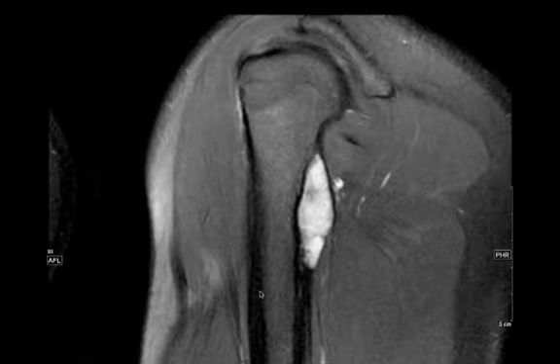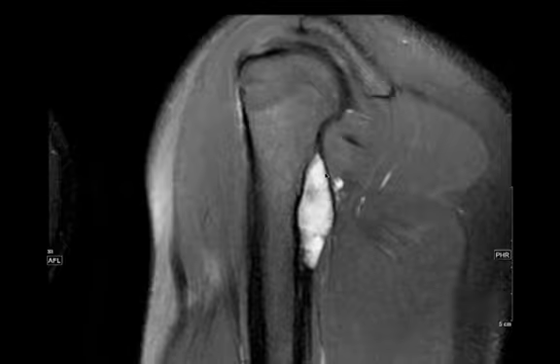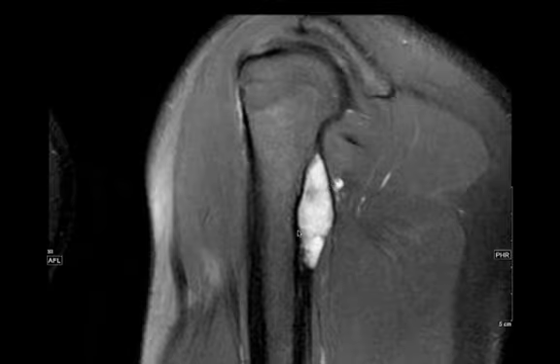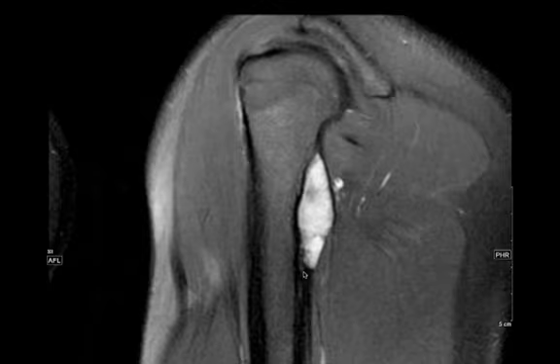This was a coronal MR just to show you a nice example of a juxtacortical lesion, very bright on the T2 weighted sequences. This one turned out to be a juxtacortical chondroma, just to show you what one looked like. Really nice example of how it's arising right next to the cortex of the bone, kind of in the periosteum, and then it'll grow under the cortex. So you can say, well, is this a cortically based lesion? I think that's fair enough to think about based on this image, but in this case it was a juxtacortical chondroma.